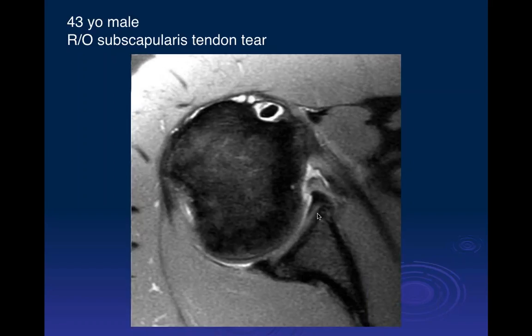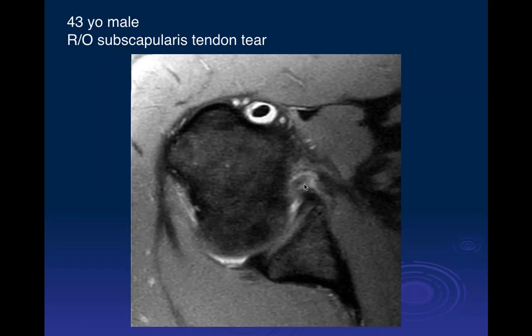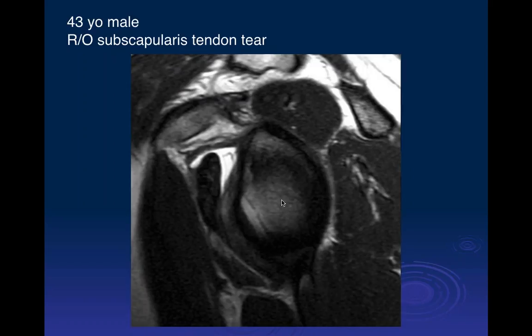If we go to the next cut down, those two seem to come together in the labrum, and that other structure is very gray and thickened and continues to go more inferiorly, and then comes down here where it looks like it's going out toward the capsule. So here we have this black structure and this gray structure coming all the way down here.